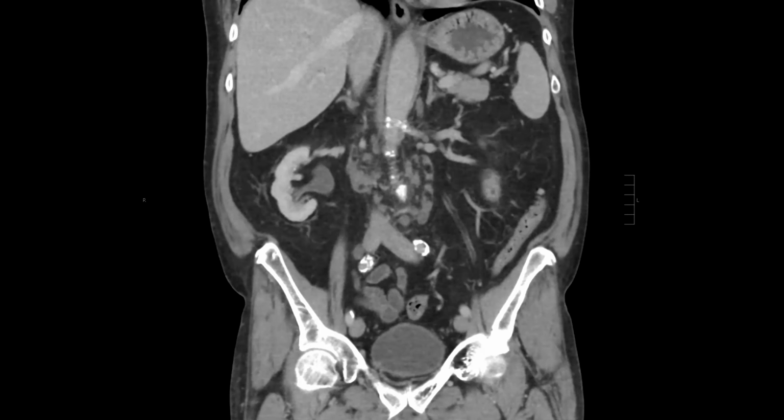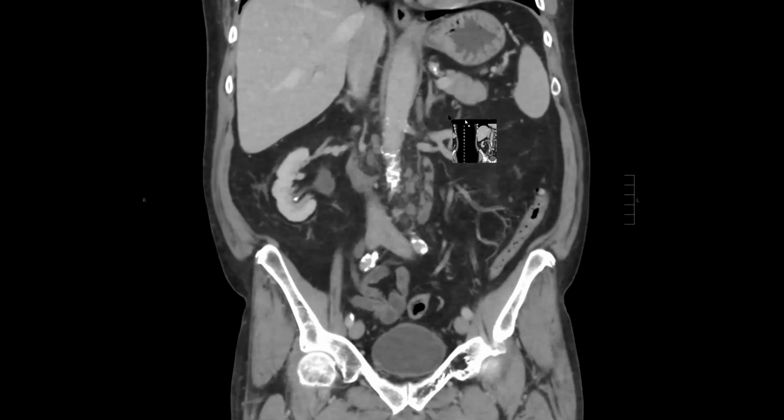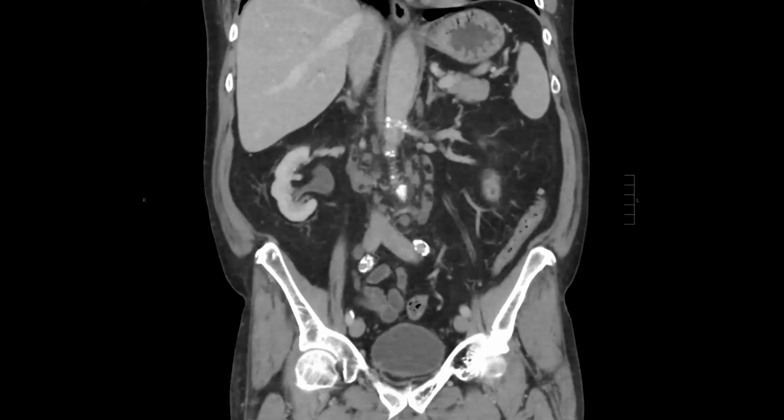Yeah, it is cool though. They don't look like normal lymph nodes there. Yeah, dots. And it's treatment associated. It's these blobs of macroscopic fat, treatment associated with this Ibrutinib for CLL.